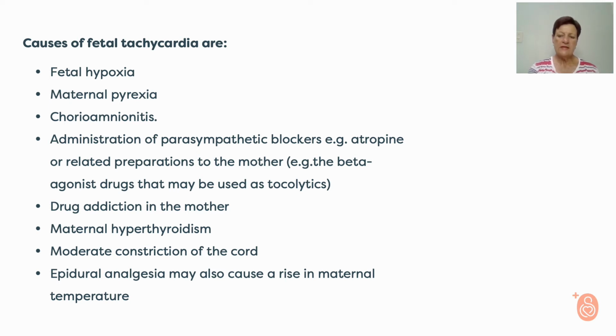Remember when we did the physiological changes in lesson 4, that eventually after persistent hypoxia, the fetal adrenal glands are being stimulated, and that eventually causes tachycardia. So here is tachycardia, obviously one of the main effects of fetal hypoxia.